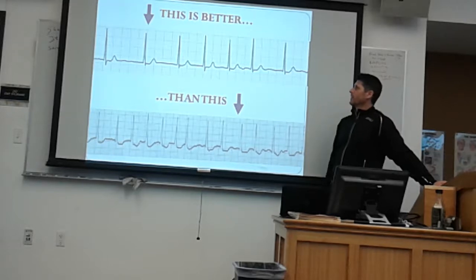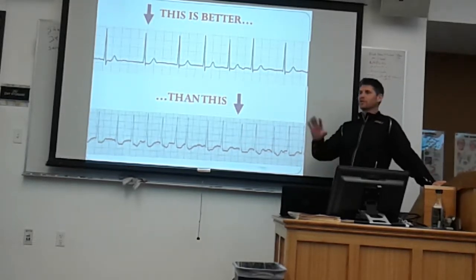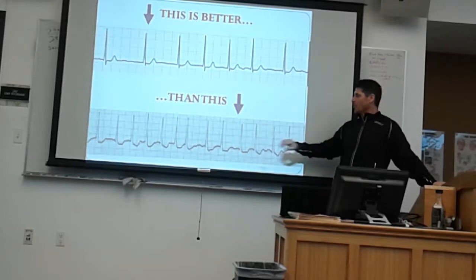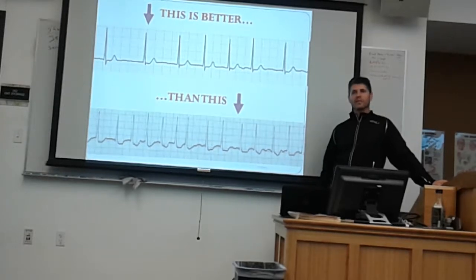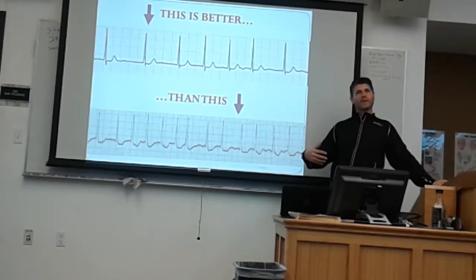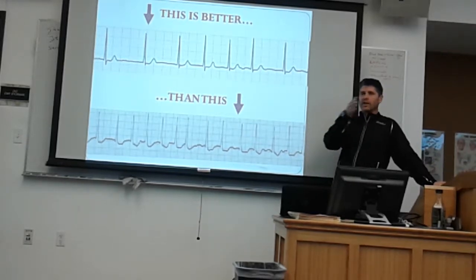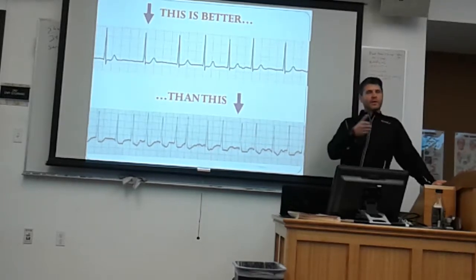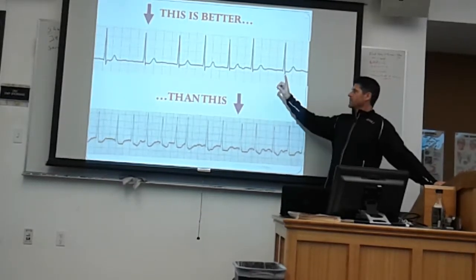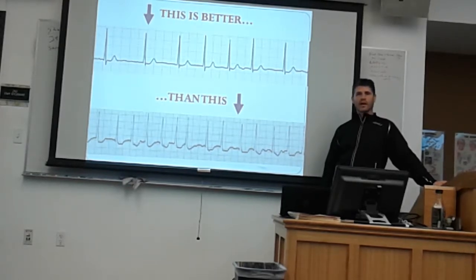Okay, now, I'm not going to argue with Chris, except for when you take exams or when you're trying to do things on here. When you have a fast AFib, we call it RVR. Don't get confused by that. He was telling you to not worry about that because he's wanting you to not be confused by what that means, rapid ventricular response. What I'm interested in is whether it's a fast AFib or a slow AFib. A slow AFib is better than a fast AFib.